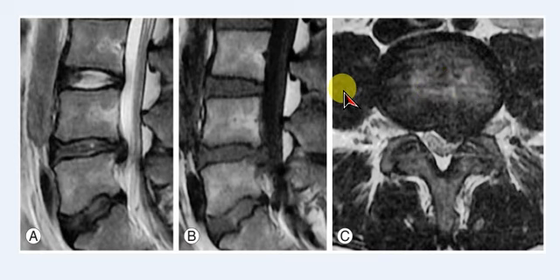This is very easy to understand. First of all, find the pathology in the mid-sagittal or the para-sagittal images. For example, you can see this is not normal. The disc has extruded from its vicinity, and it is compressing the posterior thecal sac, and luckily the level is, I personally think, L4 L5, so at this level there is no spinal cord.